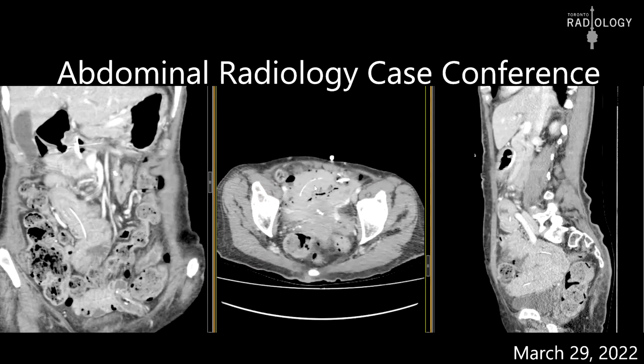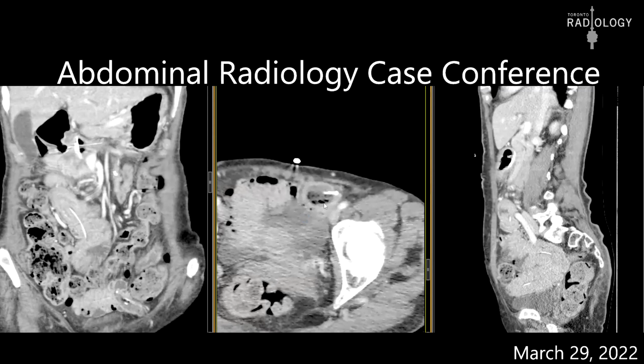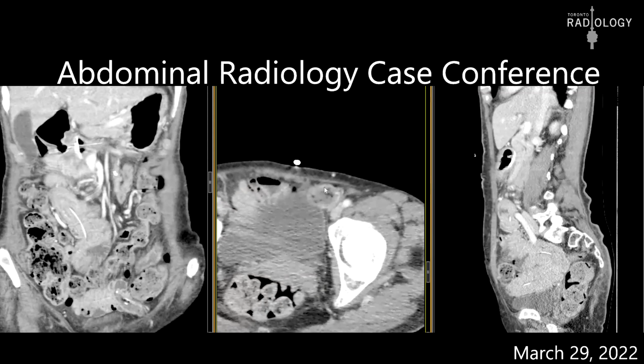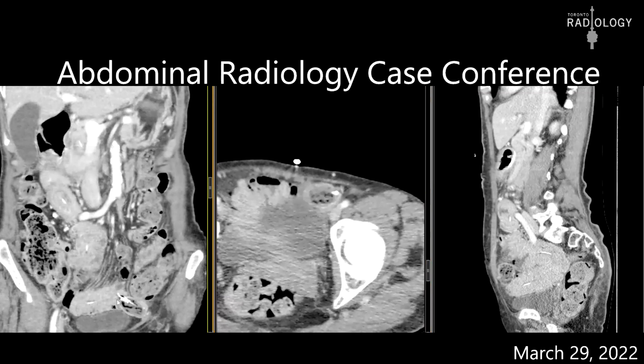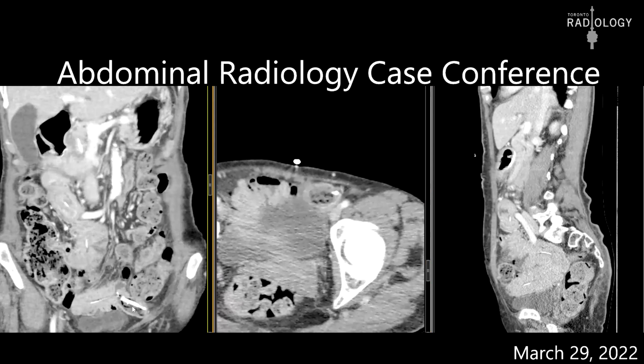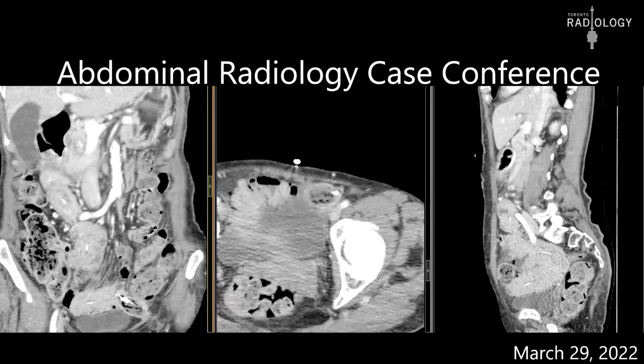And if you see here, the tip of the tube has this mottled material over it, which doesn't really make any sense. Why should they have mottled material over it? So then, putting everything together, all of these are phytobezoars.